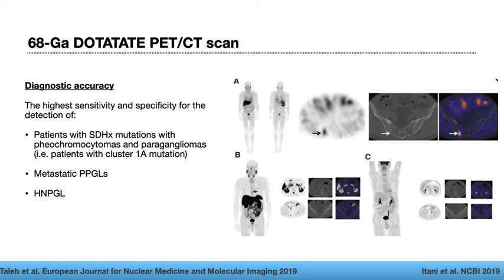That MIBG study showed increased uptake in multiple osseous lesions indicated by the white arrows. The patient had been subsequently treated with iodine-131 MIBG therapy at that time. Recently, the patient presented again with elevated tumor markers. An FDG PET scan was arranged, which is shown in panel C. It showed minimal to no uptake in the whole body.